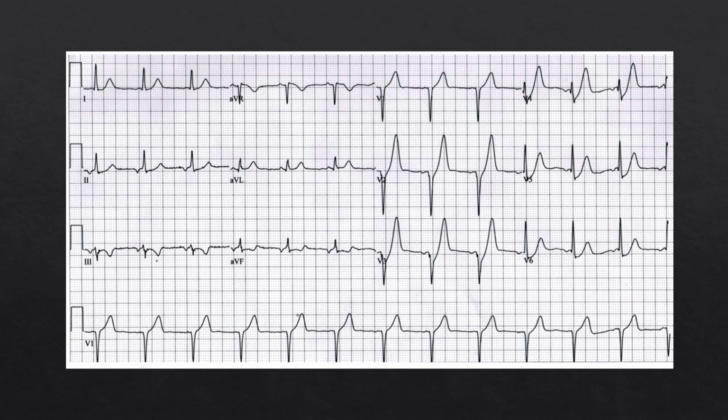You look, and hopefully you notice some tall symmetric hyperacute T waves located in the anterolateral region. And there's an extra finding alongside these hyperacute T waves, which is some anterolateral ST depression. So this is a very specific and concerning sign. This is something called De Winter's T waves, and this is a very early left anterior descending occlusion. So this is a STEMI equivalent essentially.